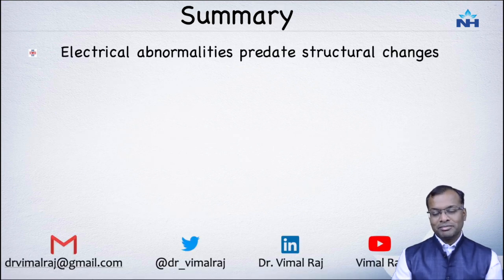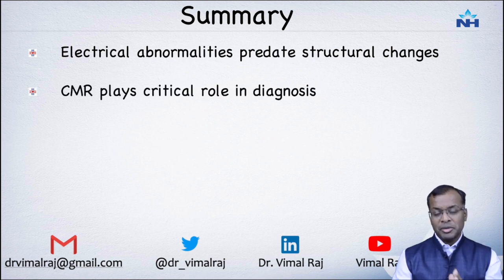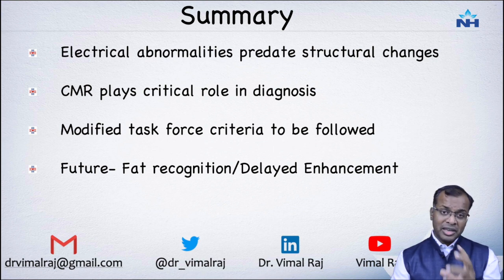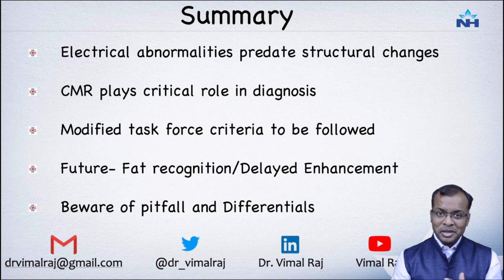So in summary, electrical abnormalities predate structural changes. Cardiac MR plays a critical role in the diagnosis of these patients. Follow the modified task force criteria. In future, I suspect fat recognition and delayed enhancement, especially with advances in cardiac MR imaging, will form an important part of the diagnostic chain in these patients. Until then, beware of the pitfalls that I have shown you and the differential diagnosis, and I'm sure you will be able to make the right diagnosis in most of these cases.